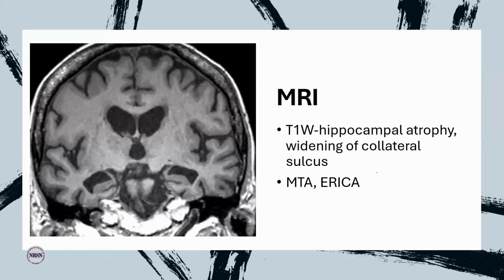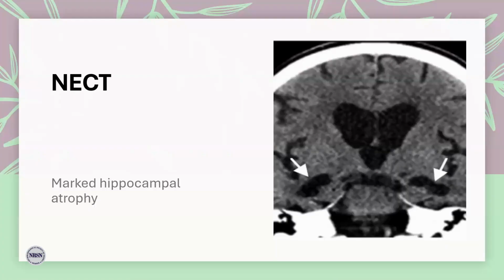So this is a patient that has Alzheimer's disease. Now, CT is also employed in the evaluation of dementia. Basically, in the absence of MRI in low-income countries like Nigeria, where we have a paucity of centers with MRI, CT can come in handy. This is a cone down coronal reformatted CT image of the brain at the level of the lateral ventricle.